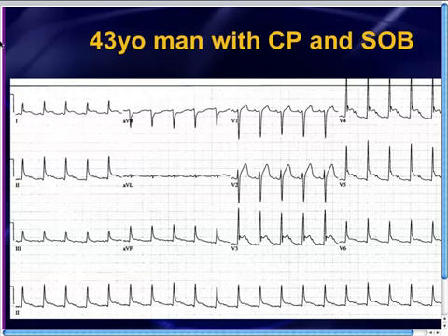It's simply, I don't know, artifact or other stuff, miscellaneous stuff. I'm not really sure exactly what's causing those little extra things, stuff, blips, other technical terms for those things. But again, I think it's good to always be a little paranoid when you see those extra blips in there and get your calipers, map them out, because it may be extra P waves. And if those are extra P waves, you're looking at a second degree AV block with 2-to-1 conduction, right? But in this particular case, you took the time to map it out. They don't map out. And so that turns out to be just artifact.